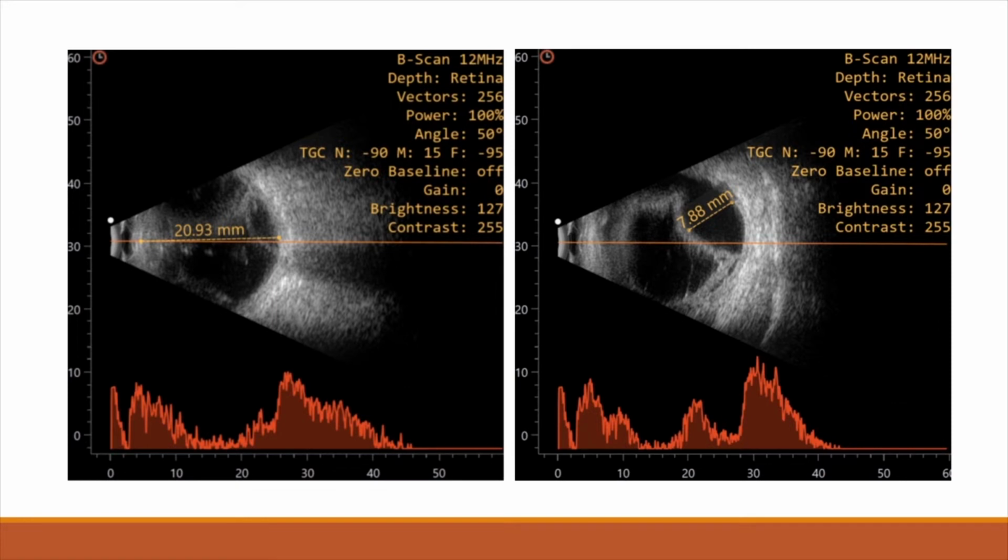And this is a USG scan. The first one is the axial scan showing IOL reverberation. Vitreous shows low to medium reflective dot echoes, and we can see there are two hyperreflective membranous dome-shaped echoes. In the other scan we can see it is suggestive of a serous choroidal detachment with the highest height of 7.8 in the nasal quadrant.